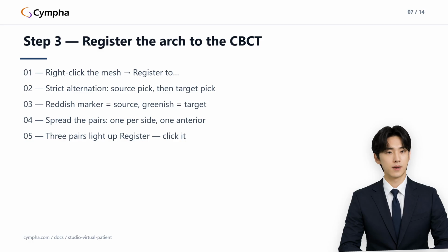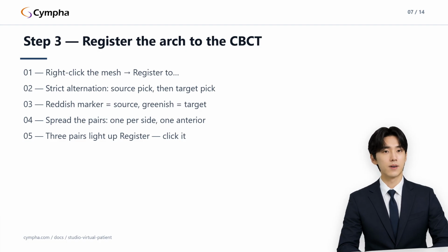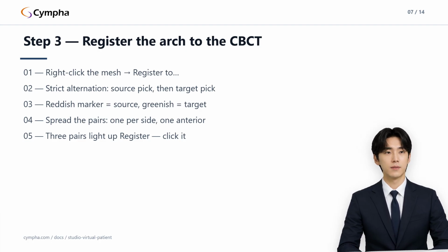The panel's 3 buttons do 3 genuinely different things, and knowing which is which saves real frustration. Register applies the computed transform. Cancel restores the source mesh to the exact pose it had when registration started. That's your escape hatch when the picks went wrong. Close just dismisses the panel. Nothing applies, nothing rewinds. Use it when you open registration by accident.